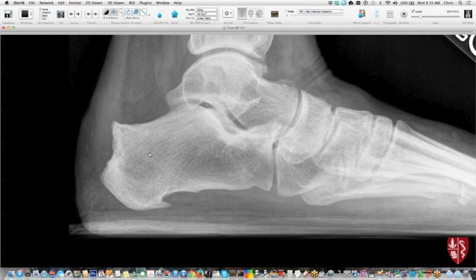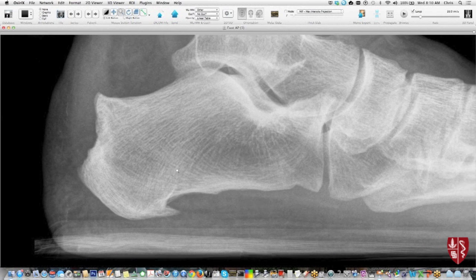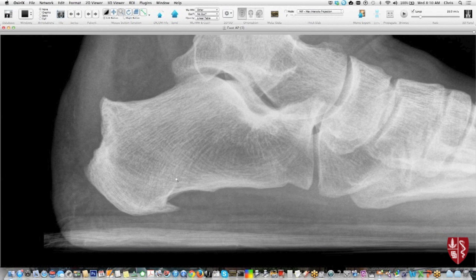It sounds like a generic term, but it's one of the seronegative spondyloarthropathies, and compared to psoriasis, it probably has a little more tendency to involve the foot, and especially regions like the retrocalcaneal bursa in here. And it can cause erosions, which this patient maybe has a little bit of patchy lucency in here, not very discrete erosions. It can also erode this plantar enthesophyte here. So if we see that in the right setting, we can raise the possibility of reactive arthritis.